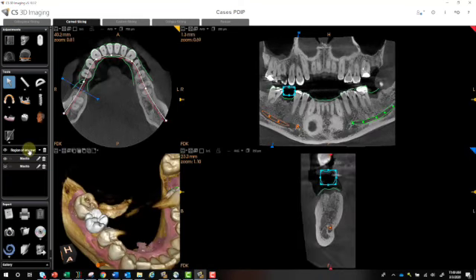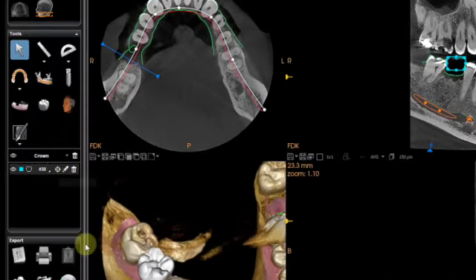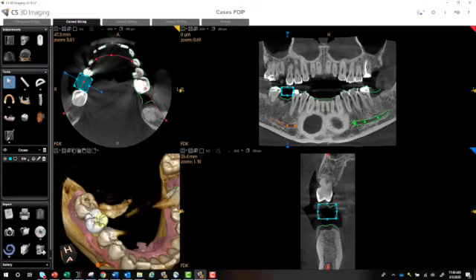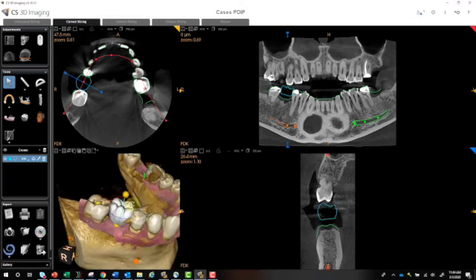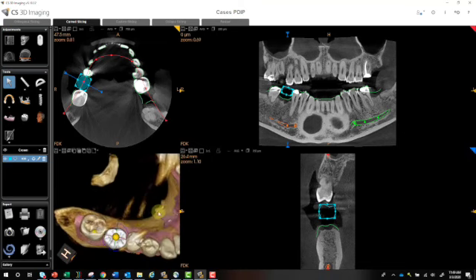In this particular case, now I can go ahead and see my crown. So now when we go to our object area, we can select our crown, and this little icon will center all of my views on that crown. And I can also click on the 3D rendering of the crown and visualize everything here and manipulate exactly how I want. These yellow nodes will increase or decrease the crown in all the dimensions. So every single dimension, it will increase or decrease.